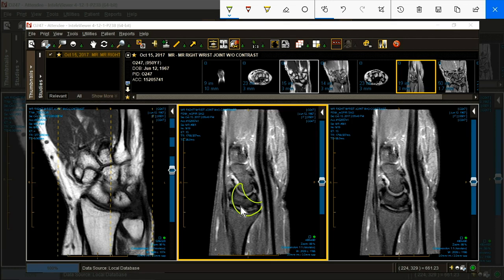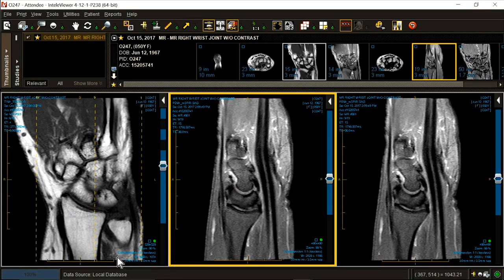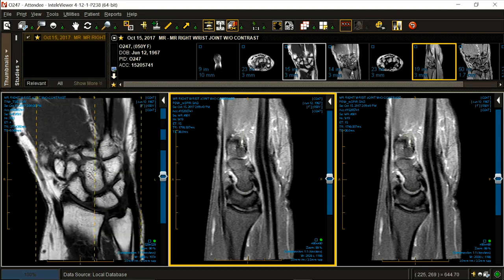When it tilts forward too much, VISI, volar intercalary segmental instability. When it tilts backward with the appropriate other signs, then I would consider DISI, dorsal intercalary segmental instability. But there's more. What if everything's lined up properly?